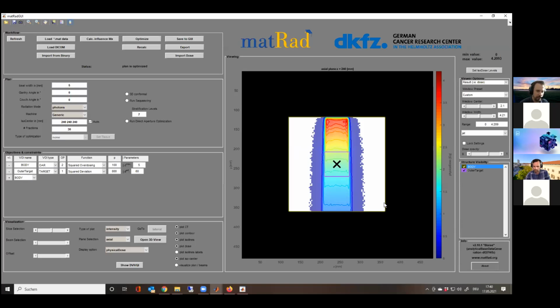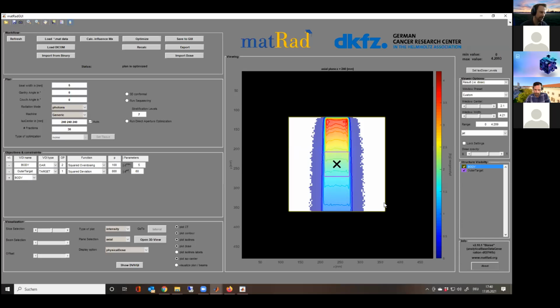But if you arrive at the step, everything is correctly installed and there shouldn't be any major problems anymore. Okay, so that is basically the test we wanted to do today. For the ones that use code, there's also a very simple way to test everything apart from that.